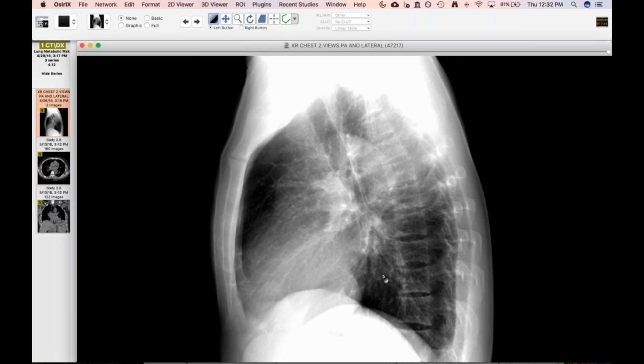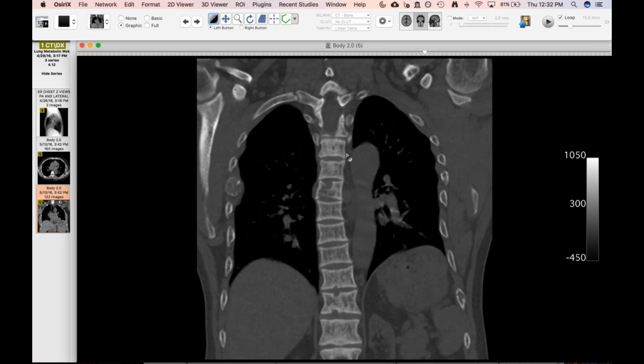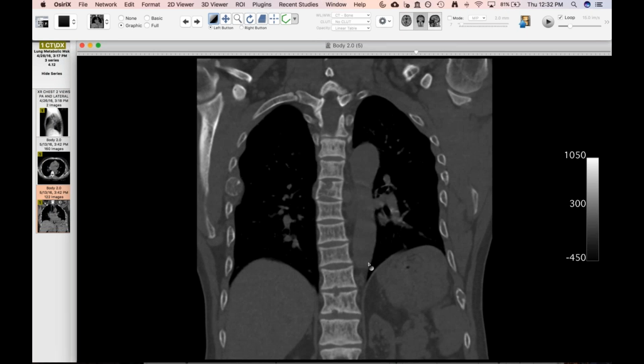So you don't have a sharp corticomedullary interface, and that's why the outline of the vertebral bodies is so fuzzy here. So that's okay. Part of renal osteodystrophy. Yeah. Jeff was going to say something.